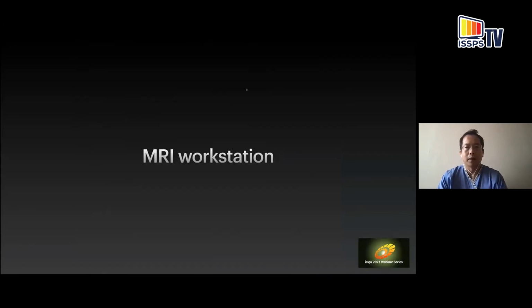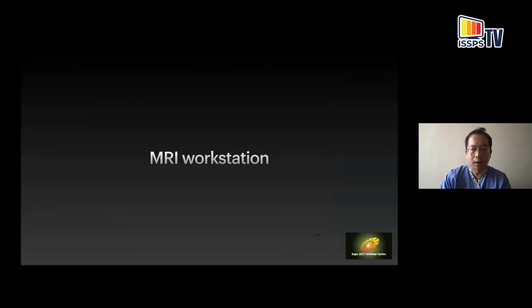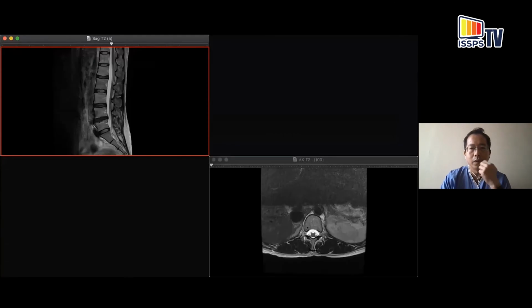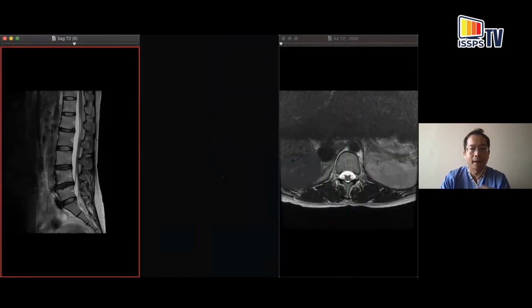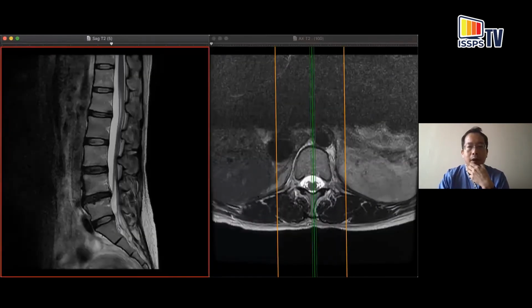Okay, and now I just want to shift us to the MR workstation, try and see if we can identify some images there. Just give me a second. Okay, I have two images here to share with you. And now you can see the MRI side by side.